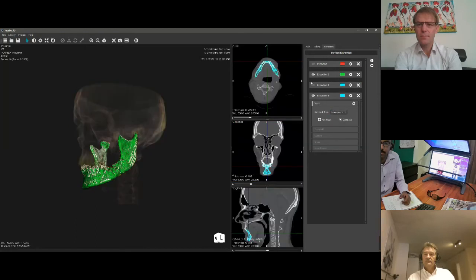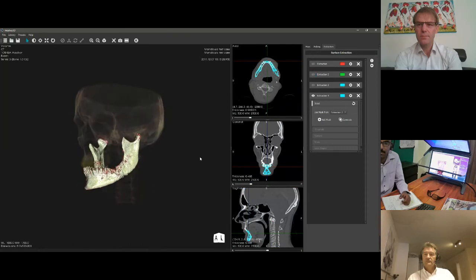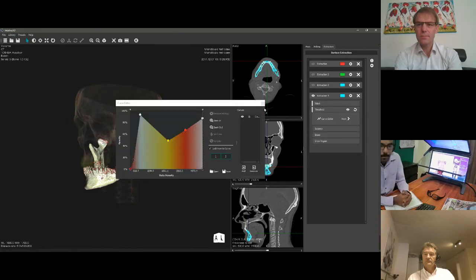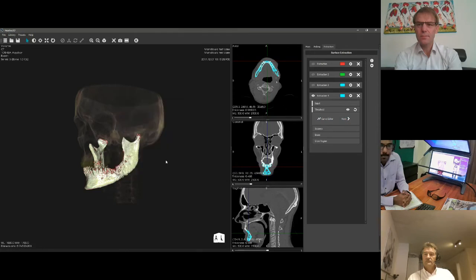It's this part. I don't want to see this, and I say I only want to use part of this data now. So I'm going to make an extraction from this one and say, okay, this data I want to keep. Love what I have here. I don't have to do anything there. And I'm now using my scissors to cut a piece off, basically. So I say I want to keep shape, and I'm cutting.